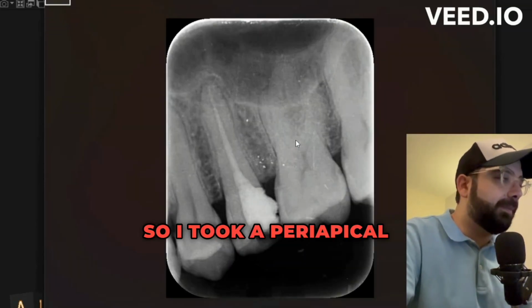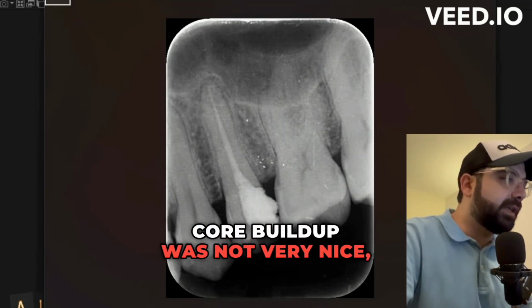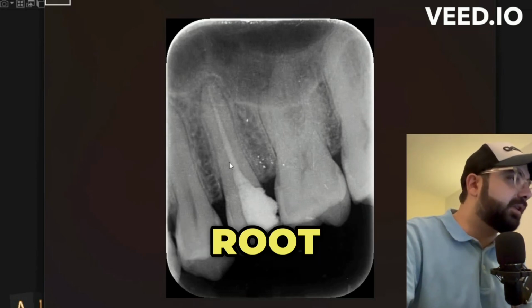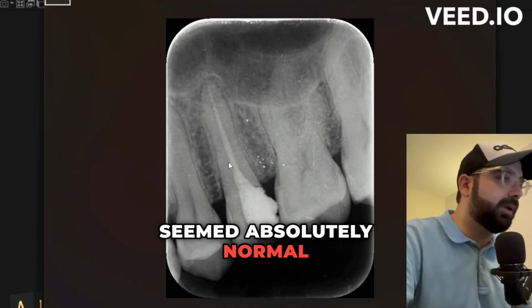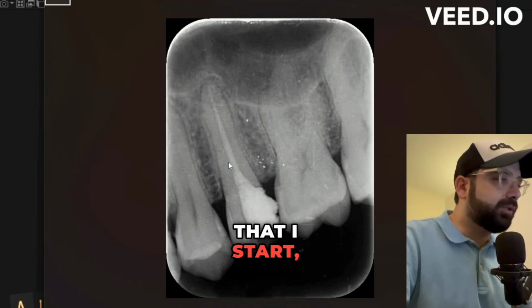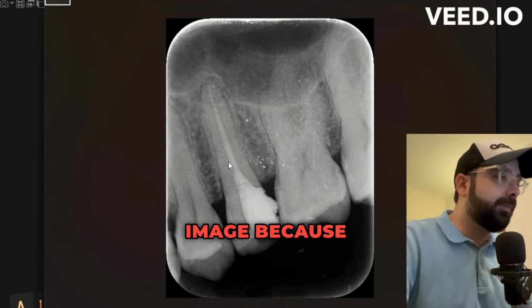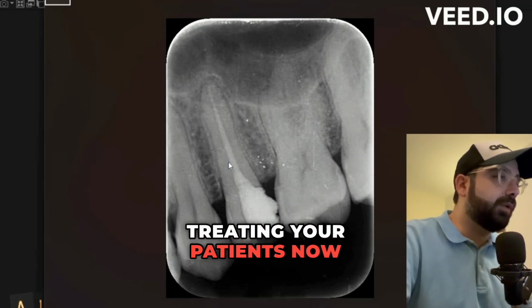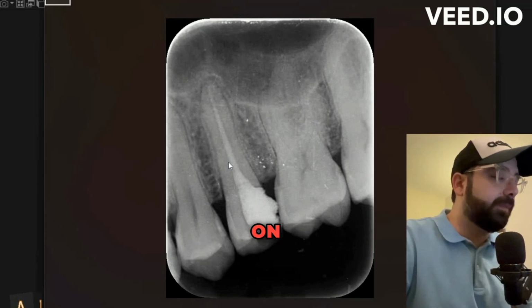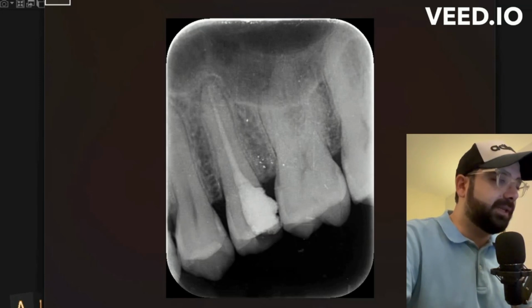So I took a periapical X-ray and looked at the core buildup, it was not very nice, very poor contact. But at first glance, the root canal seemed absolutely normal on the periapical. But like every case that I start, I always make sure that I get a CBCT and a three-dimensional image, because that's the gold standard for treating your patients now, because there's so much information that you will miss out on, especially if you do not have a 3D CBCT.